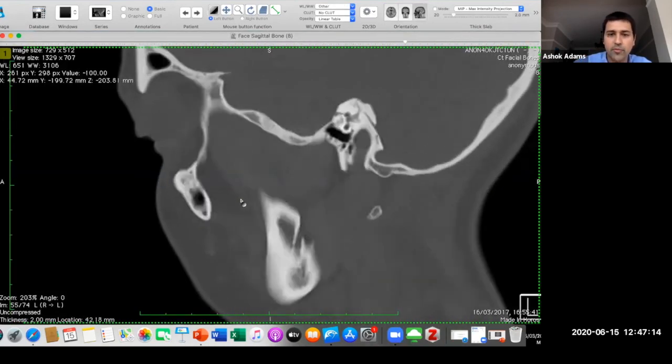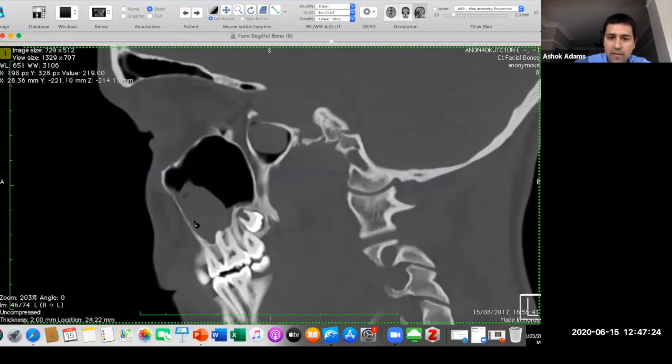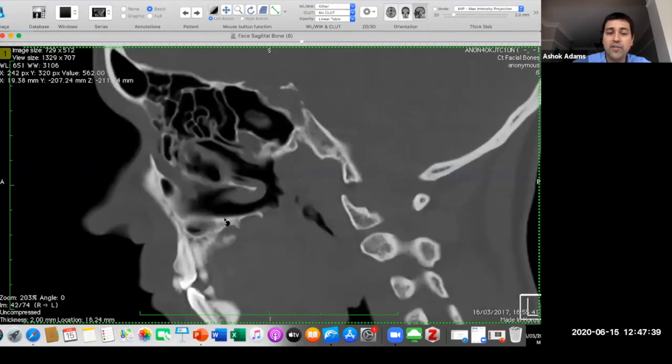This is an example of someone who's got a maxillary sinus problem due to a tooth, but we'll typically comment on whether you've got periapical lucencies, whether you've got caries, different patterns of caries, and if you've got just mucosal thickening in the antrum, one of the things you're going to comment on is the integrity of the alveolar ridge. So if the bony ridge is gone and you've got a carious tooth and mucosal thickening, that's when I'll typically start to flag whether this is odontogenic maxillary sinusitis.